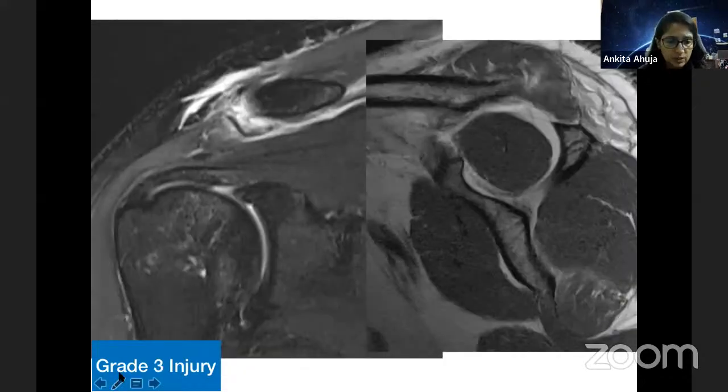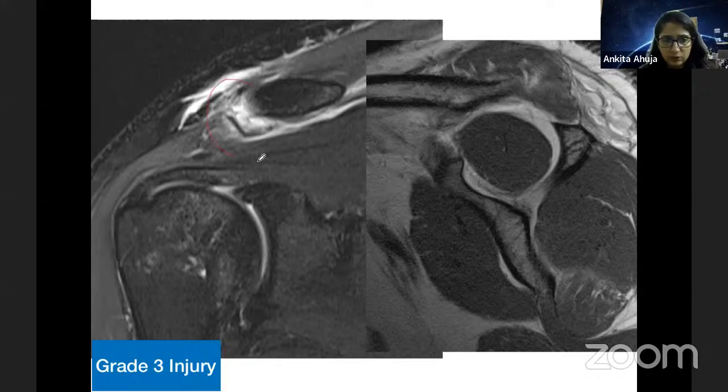And then moving on to this again, you cannot see the capsule, you see a lot of edema. So there is definitely acromioclavicular capsular injury.